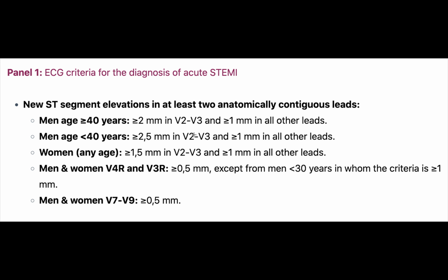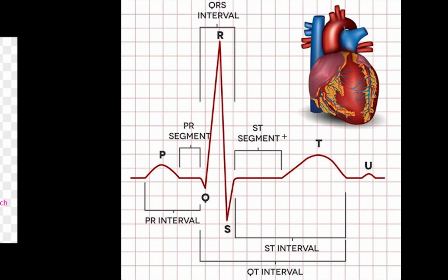And this isn't cut in stone as far as, if people's hearts are dying, you're not going to see this all the time if they have an occlusion. Some people are slightly different, but in general, this is the criteria we go off of.